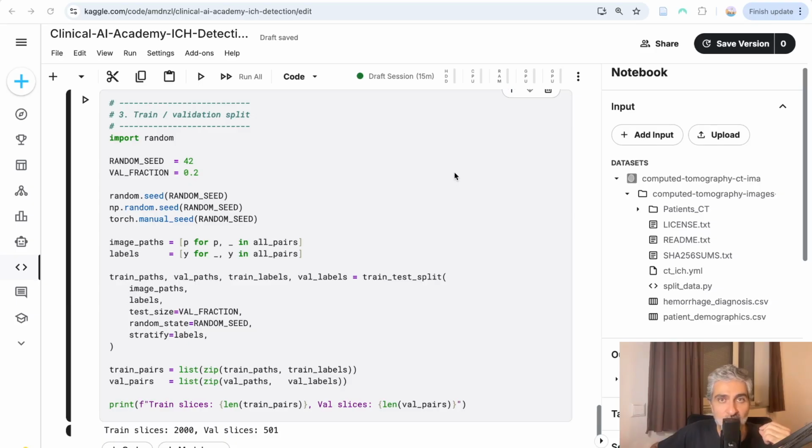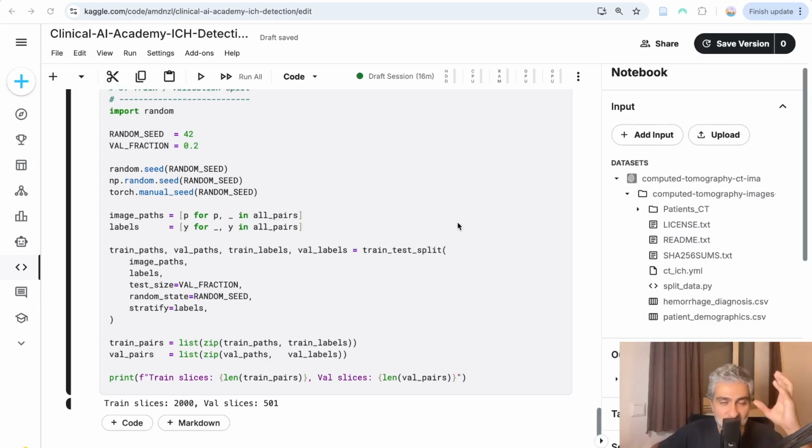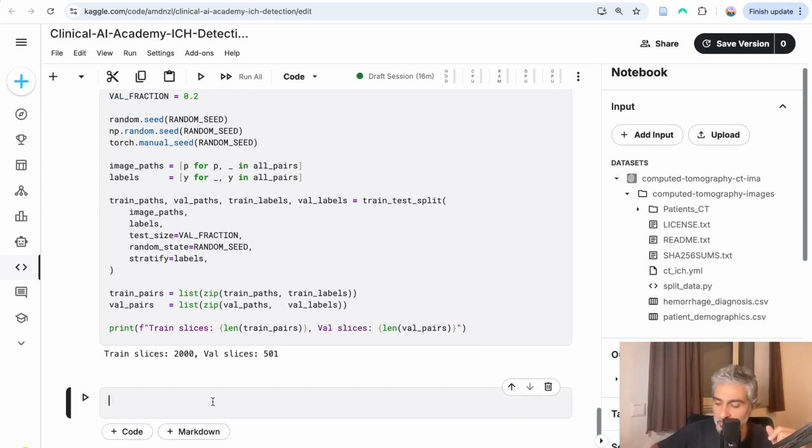Yeah, so we have now done the data splitting, and next we're going to use PyTorch to do some pre-processing for us, which is basically to look at those pairs and put them in a similar size, normalize those images, put them in grayscale, and do all this data manipulation so that you make them more homogeneous, so the model learns better, you improve your modeling, and then generate those tensor structures that you need for your model.